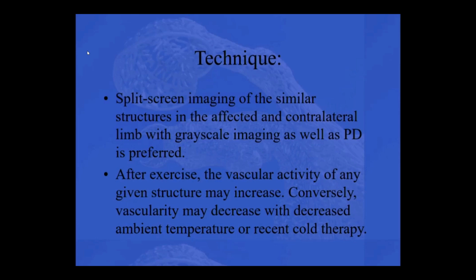The same thing: I live in Michigan, we have very hot summers and very cold winters. We are happy that we have a climate-controlled exam room because you would see an effect of decreased vascular activity in the cold leg. And so it's nice that that doesn't change a lot if I see the horse first in summer and then I see it in winter, and I get completely different images.